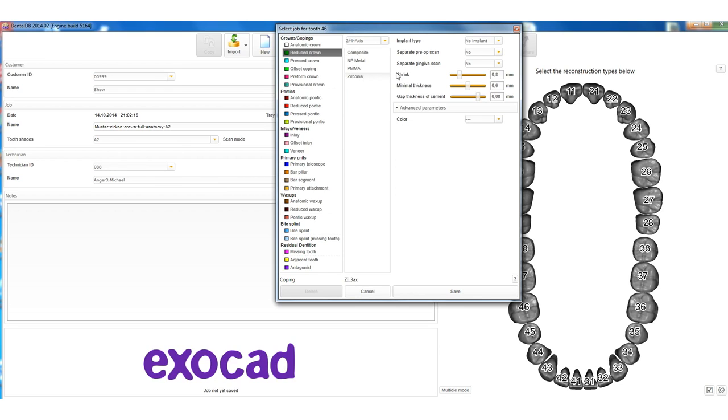If you want to provide an implant, you can select the type of implant. If you choose custom abutment, you establish an abutment that will be supported with a cemented crown. Or you want to set up a custom abutment with manual positioning of the screw channel. If you want to create an occlusal screwed crown or bar post, then select occlusal screwed. Or you can choose the same with manual screw channel direction. In the present case we have no implant, so we choose no implant.